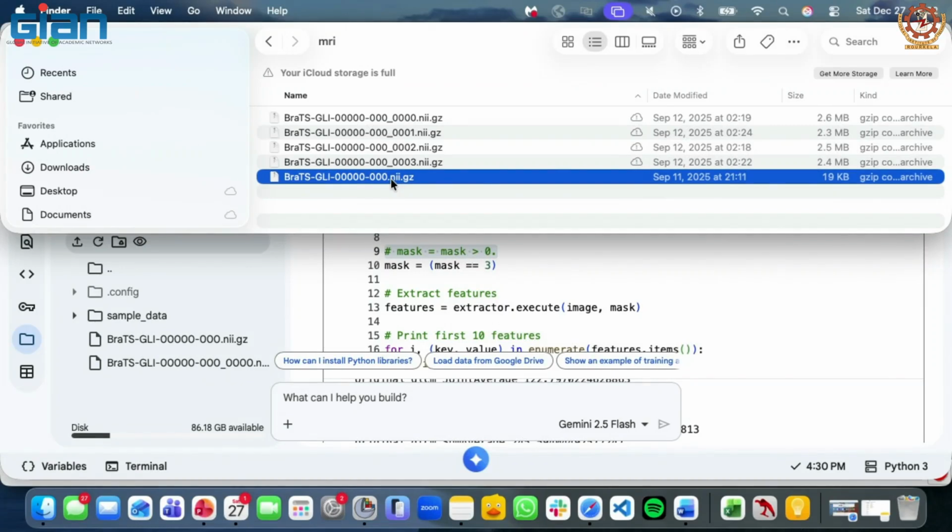They will have some errors. Send it to a radiologist. The radiologist will manually verify that these voxels are wrong, these voxels should be there, these voxels should not be there, and then finally they will save the segmentations after the correction, and then you can use them to extract the radiomic features. As of now, for this dataset, the dataset providers gave us the segmentation labels.